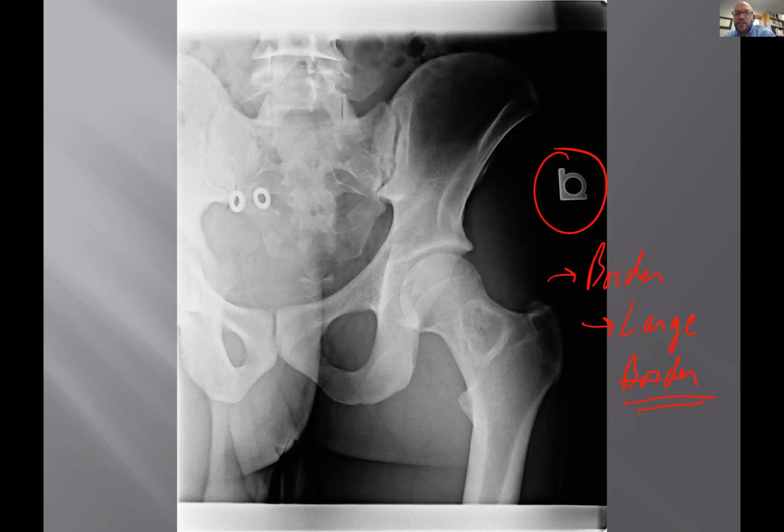Do you guys see any definitive periosteal reaction or soft tissue mass or that cortical breakthrough that would cause those kinds of things on this case? Anybody see that? Okay, yeah, I agree that there's no definitive cortical breakthrough here.